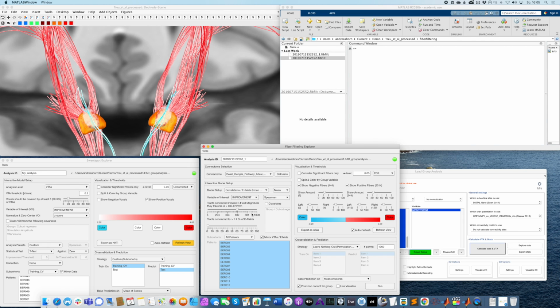But again, these are the settings where we also don't really know. There are biophysical models that could be used, or literature data where you could look, we assume a certain type of axon and we believe it's an all or nothing thing. We want to use E-fields, but they need to be connected to that degree, and so on and so forth. So this is really the job of you as a scientist to decide what to set here.